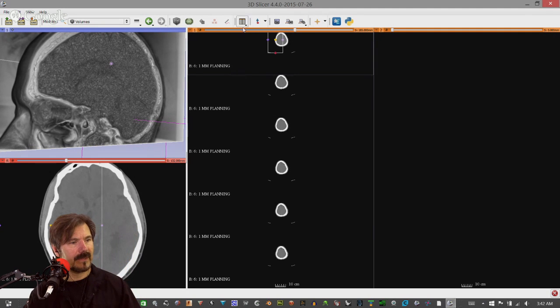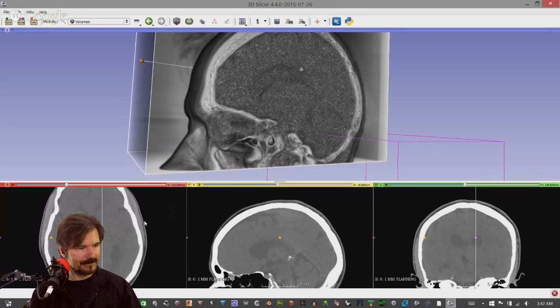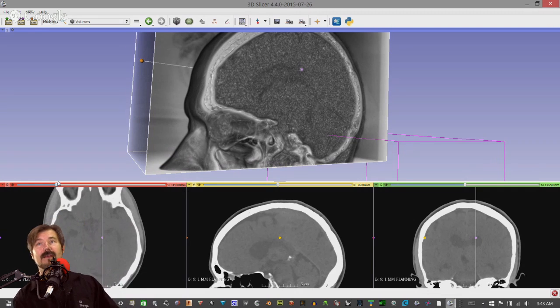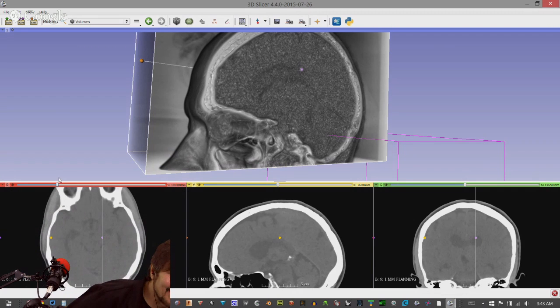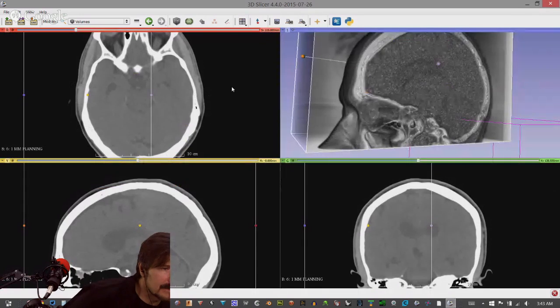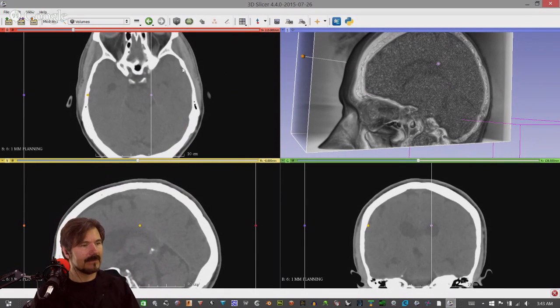That's not the mode I wanted. Oh well. Okay, so I'll just stick with this one. All right, so you want to keep scrolling down. Scrolling down, and actually, it's funny on my screen, your head's taken up. That's okay. Yeah. So you got it kind of right there, and if we're going to adjust the grayscale a little bit, go up a little bit. You can see it, and I don't know if you meant to do this, but where you have that purple dot there is going to be pretty much where it's going to come up. All right, that's perfect. All right, so come up a little bit, a little more superior.